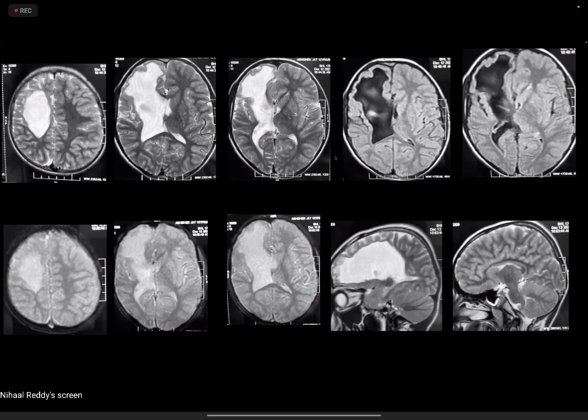But if this is an antenatal stroke, what territory is it following? That is, if we are calling this an arterial ischemic stroke. If it's just an infarct, that's fine. It's both ACA and MCA, which would be unusual. Were they twins, the siblings you showed? No, 4 years difference. It will be useful to scan the other one as well, right? Yeah.